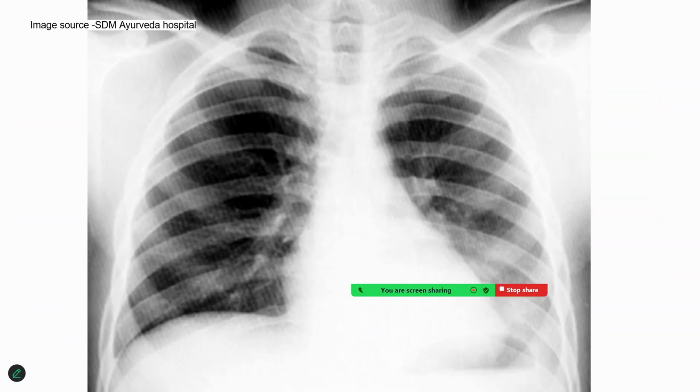Now, when you take an X-ray image, these alveoli, because they are very small structures, may not be seen independently. Instead, the fluid will produce some mild opacity, and this could be seen as small dots, small spots in the alveolar area, as you see over this area, and they are scattered.